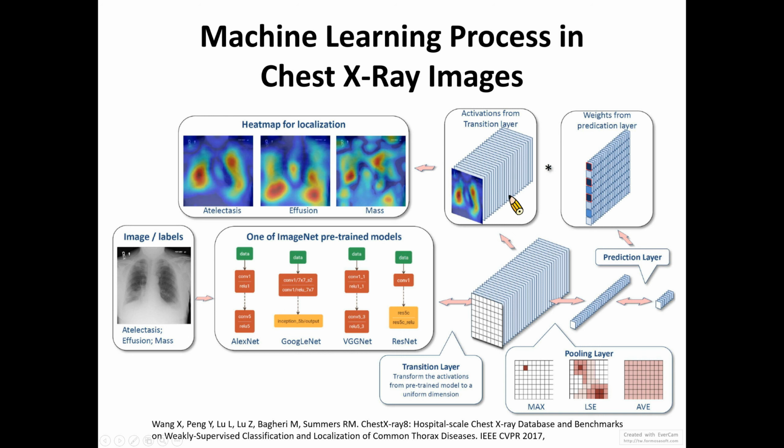In the first line, I count the number of labels and randomly pick 16 images, and show these 16 images using a loop command. I paste this into MATLAB, and you will get a subplot showing different images randomly picked from the datastore.